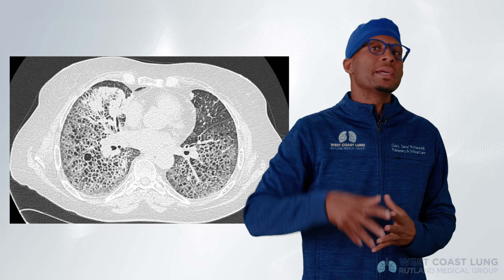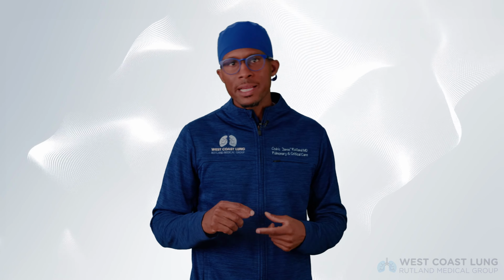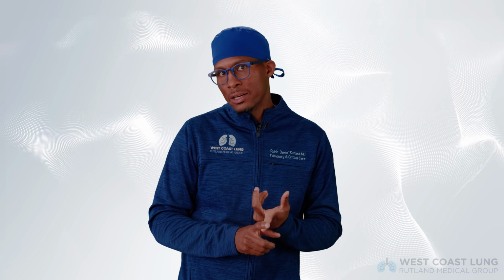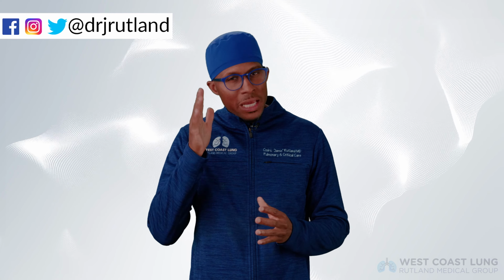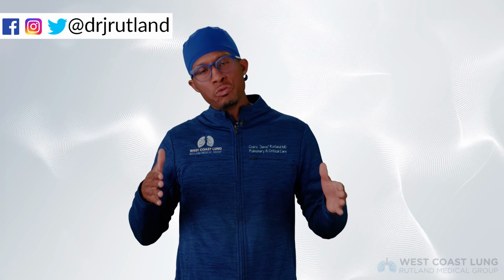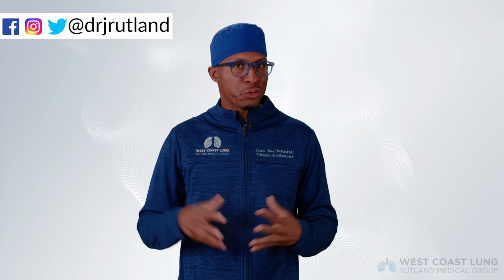I don't want you guys to be intimidated by a CT scan that looks like this. Just run through your differential diagnosis, which is going to include things like pulmonary Langerhans cell histiocytosis, LAM, Birt-Hogg-Dubé, LIP, interstitial lung diseases, and infection. Think about these things, put them on your differential, ask the patient what they've been through in their life, think about their age. This is going to help you narrow down what it is, and it's also going to help you identify how to treat it.